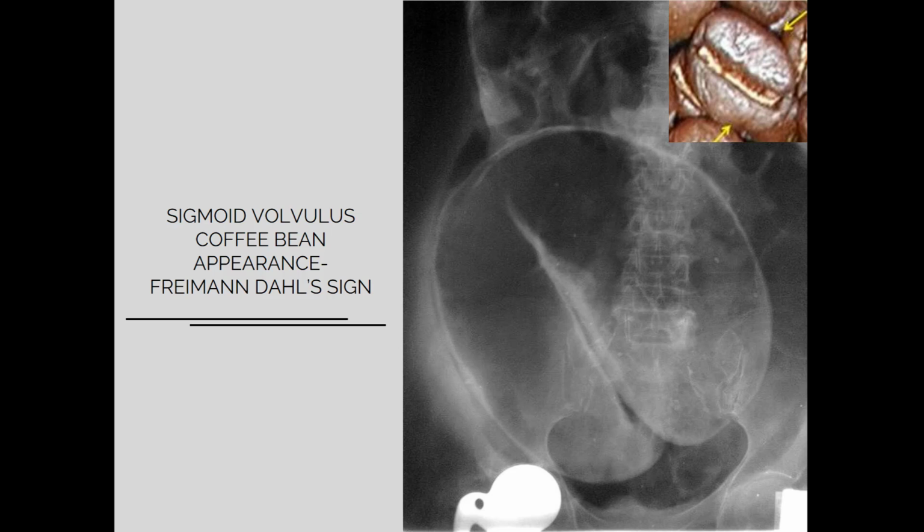Along with this main finding, you can also see that there is some highly radiodense object present. This is basically the Austin Moore prosthesis. There may have been a previous fracture of the femur, so that's why it has been replaced. Okay, but this is a secondary or associated finding. You may write it down and you will get more marks, but remember, don't lose your focus from your primary finding.